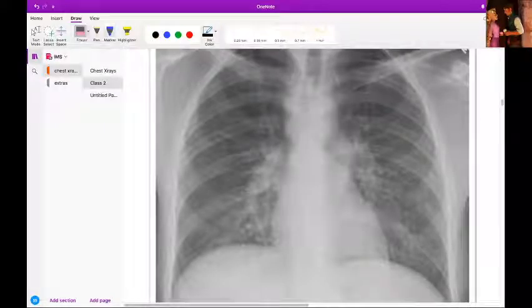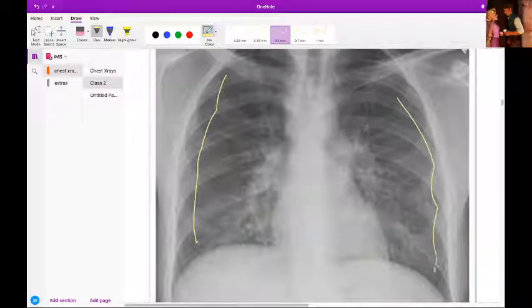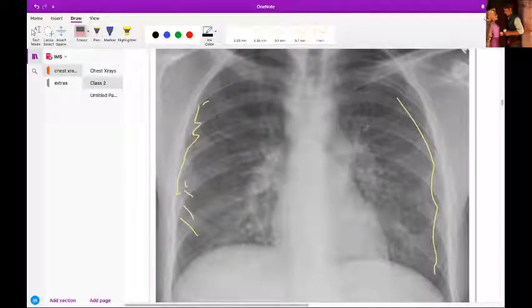Around the alveoli, I guess. So basically, what usually happens is, 1 centimeter from the pleural margin, like approximately over here or over here, this area is supposed to be clear. They're not supposed to be all these lines over here. But if there are all these reticular lines over here, that means there are reticular lesions in the lung. So a diffuse reticular pattern is there in interstitial pneumonia.